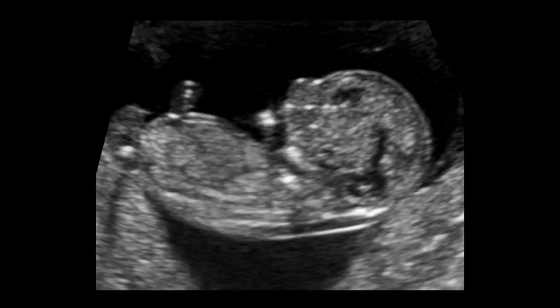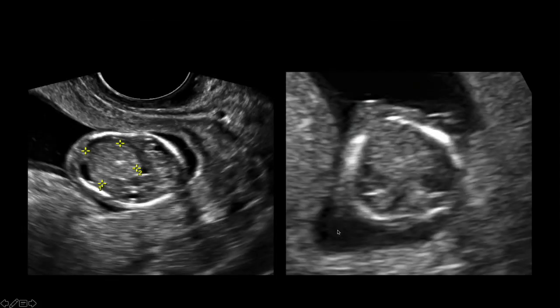Now here was a 12-week fetus that had a very peculiar mass inside its head, and that mass was protruding through the face here. It was a very dramatic look. Of course, she came in for her nuchal translucency, obviously. And if you look at the mass, it really is a very echogenic, ugly-looking central mass. And it really protrudes out the face. I mean, at first you might think, well, gee, this is a hemorrhage, but it looked like it was having some destruction in the front of the face here.